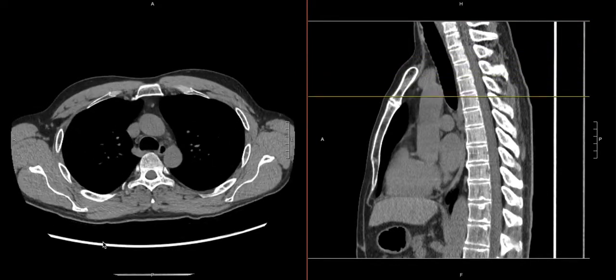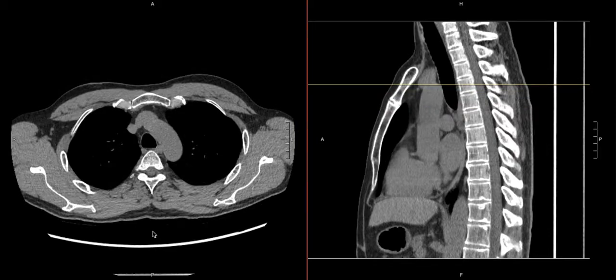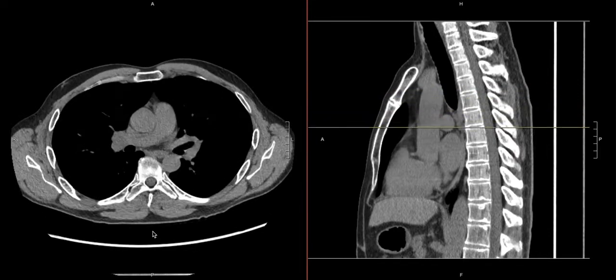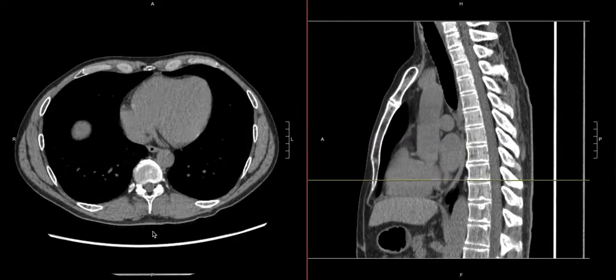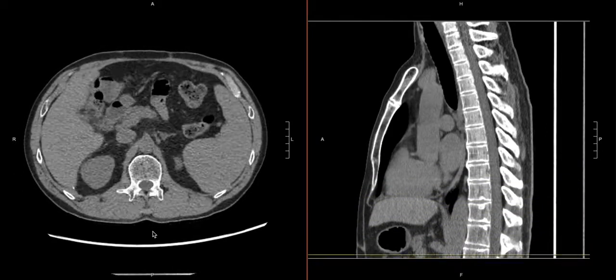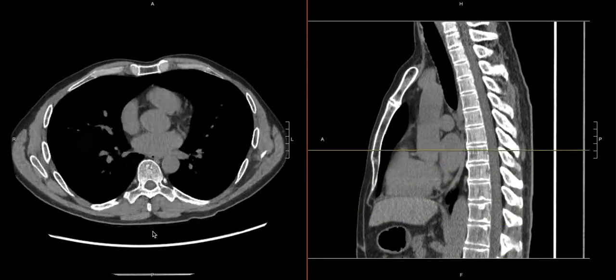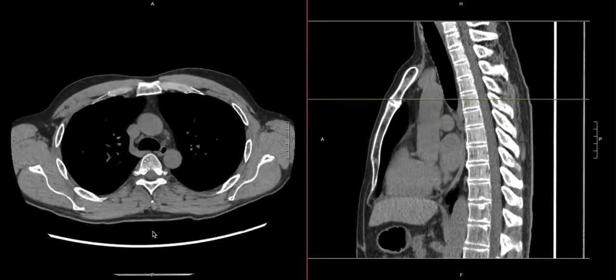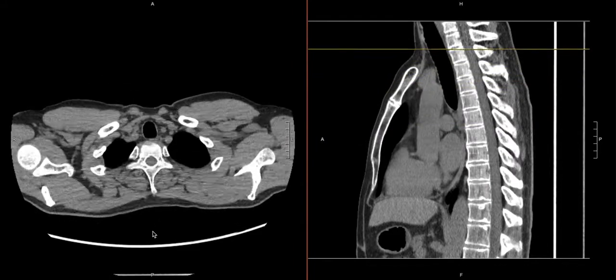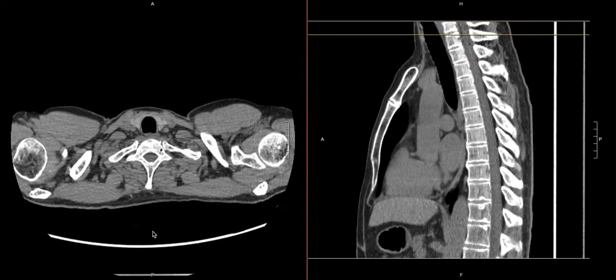There may be some instances where there are decubitus ulcers or abscesses that hang out back here. So we can take a look, go all the way down, and just make sure that there's nothing suspicious in the posterior soft tissues. Then we can come up. And again, as you get more comfortable, you may be looking at more quadrants at one time, so this will go faster. But this is a systematic, broken down version of how you go about things one step at a time.